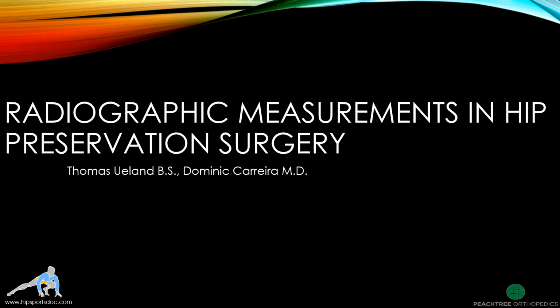This video is a tutorial on alignment and measurements taken from plain radiographs for the evaluation of the young adult hip and for hip preservation surgery.